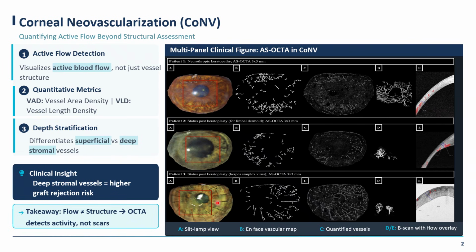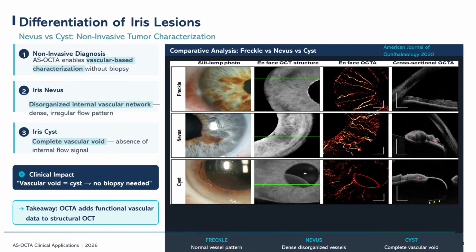Now, the most important obstacles for this technology are two things. Number one, the dense corneal opacity. If you have dense corneal opacity, this will obstruct the underlying structure, or it will provide poor penetration for the waves. The other thing, when we study the iris anatomy or the iris vasculature, the presence of heavy pigmentation will be another barrier for the proper visualization of the details of the iris. So we have to keep this in mind.